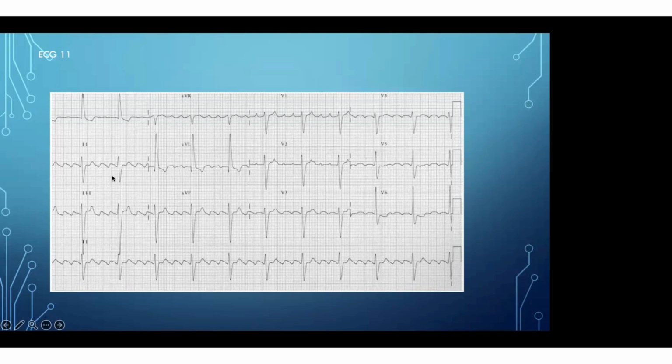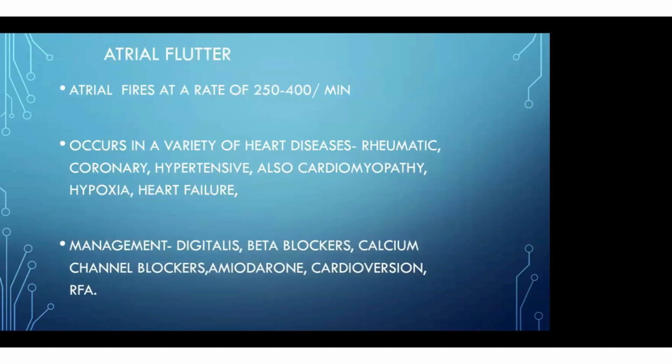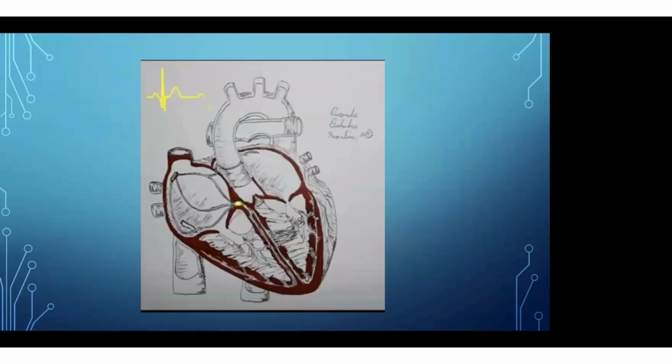We will understand the atrial flutter tachycardia circuit now. So this is the correct diagnosis of atrial flutter. Atrial flutter can come from different areas and have different morphologies. There are typical and atypical atrial flutters. In typical atrial flutter, there is a counterclockwise and clockwise loop. This is atrial flutter, and this is the circuit for atrial flutter.